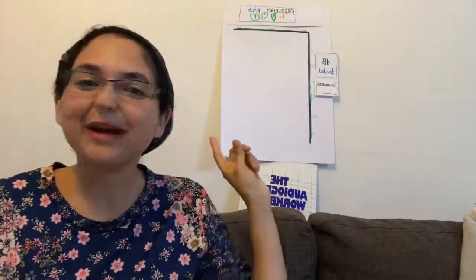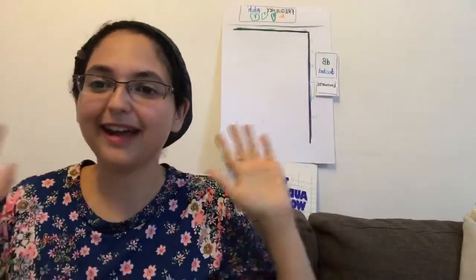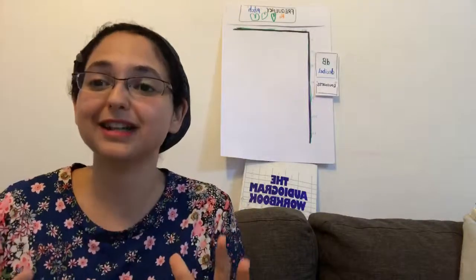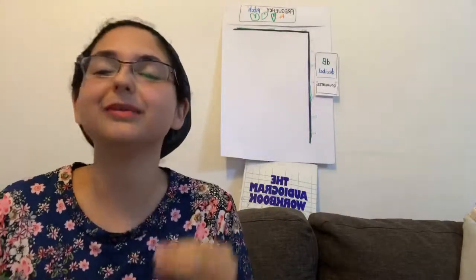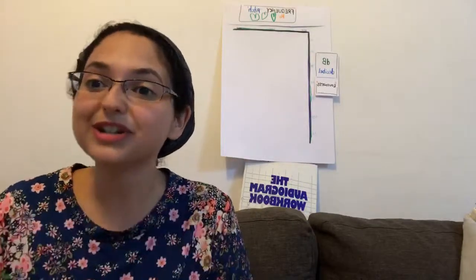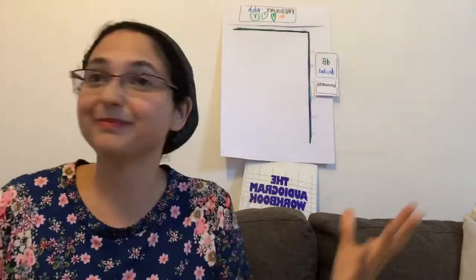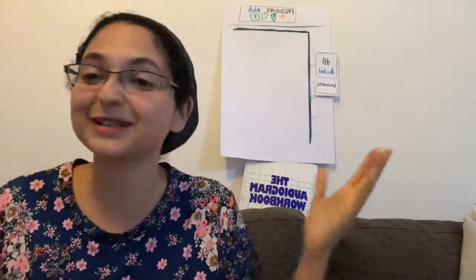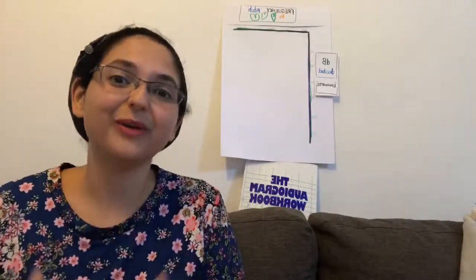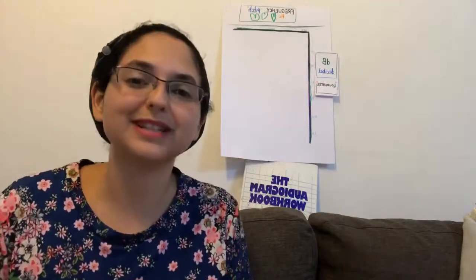Today we're going to be talking about how to read an audiogram, and I have it all prepared for you guys to get the best understanding of how to read the audiogram, what all the different parts mean, and then when you look at your child's audiogram or your own or your family member's, your parent, your cousin, whoever, you'll be able to look at an audiogram and know how to interpret what it means.